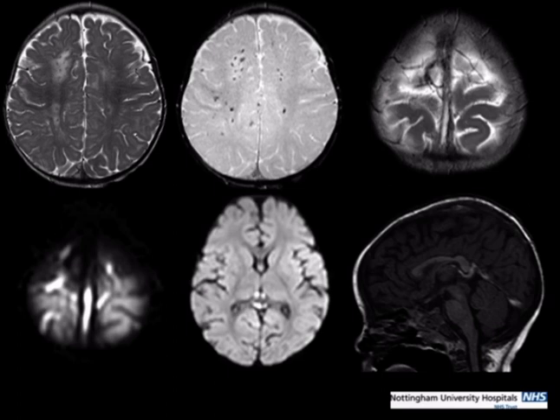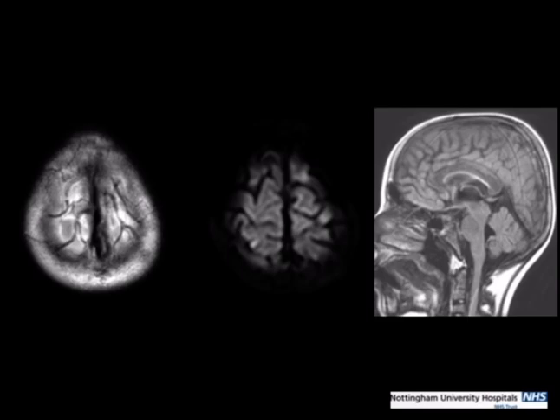And when you go looking at the sagittal T1, you can see there's already clotted blood within the internal cerebral veins, vein of Galen, straight sinus. This was a diffuse venous sinus thrombosis. The reason I wanted to compare it to this one is that this is also a diffuse venous sinus thrombosis.